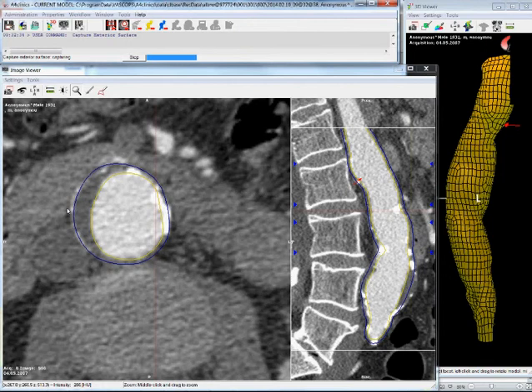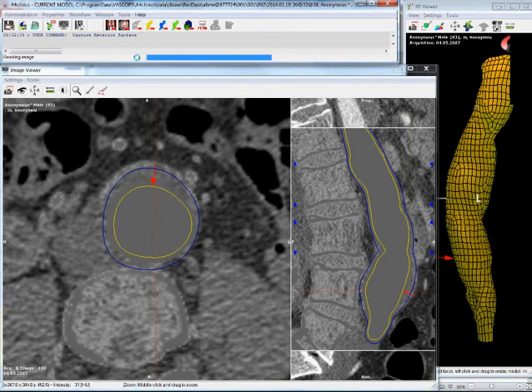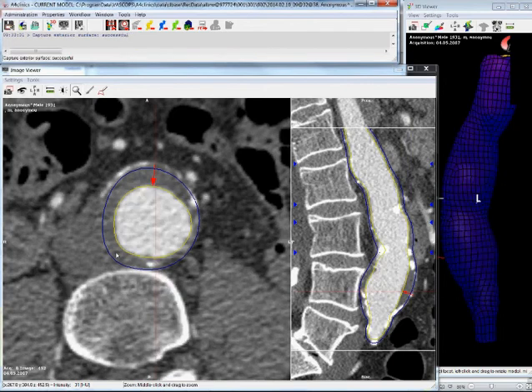Of course, in this case, the automatic algorithm will not be able to capture that very nicely, simply because there are too many artifacts in this image. So what the user does is just stop. If you see, well, we are fairly close there, and then we start with the manual interaction.